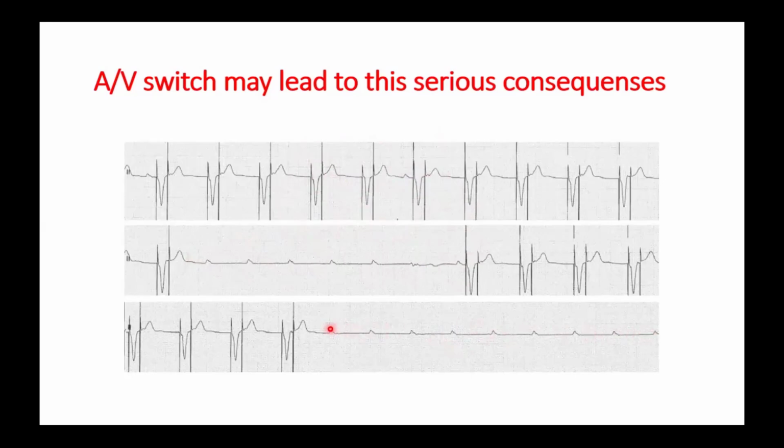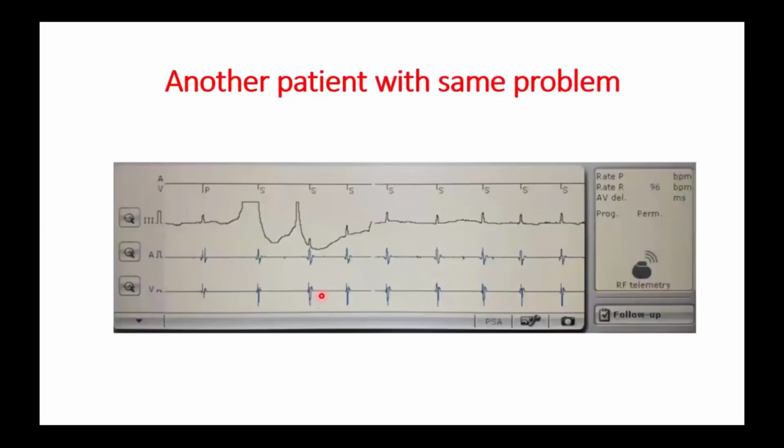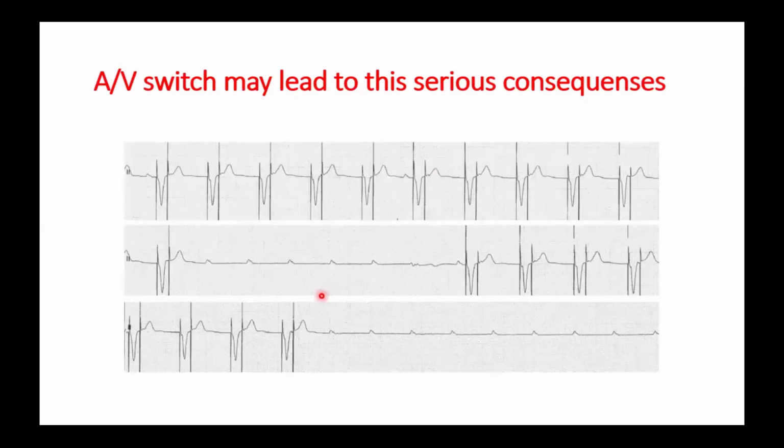As history. The device thinks that this is like a VT. Or an accelerated ventricular rhythm. Exactly. You know why it started not, it was starting good? Because it could not sense the small P wave before the spike. Exactly.